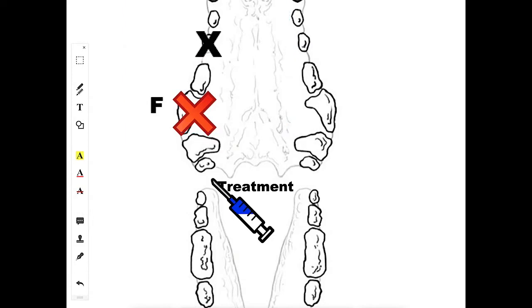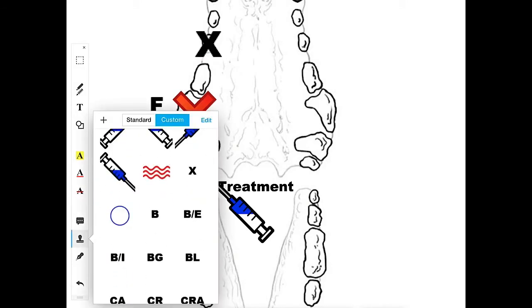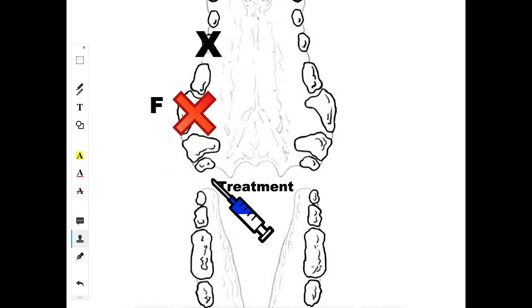And then we're going to biopsy that little oral mass. So we can go and we can say biopsy excisional, which means we're attempting to excise the whole mass, or we can go to biopsy incisional. So we can do either biopsy excisional or biopsy incisional. We're going to try to excise the whole thing, so we'll put biopsy excisional there. And there you have it.